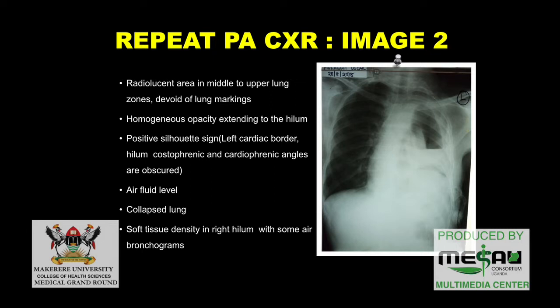I think it's a month's difference, but still, what was appreciated in the first image, most of the features are still evident after some good time, because the other one was taken, I think, in July, and this was August. We can still appreciate that the trachea is central, but there's still this homogeneous opacity with a positive silhouette sign.